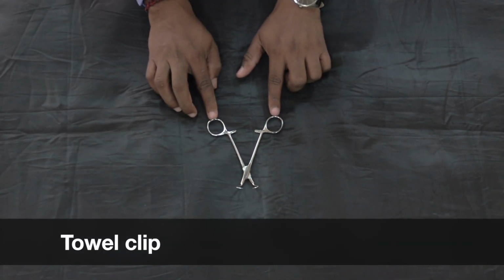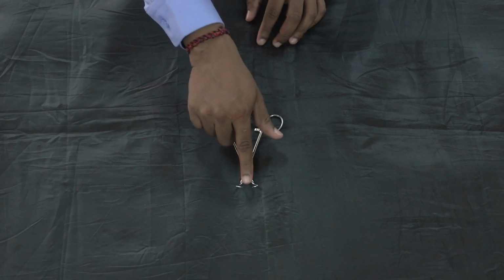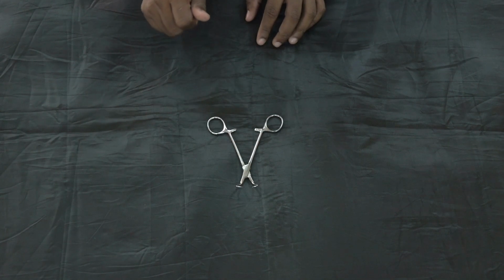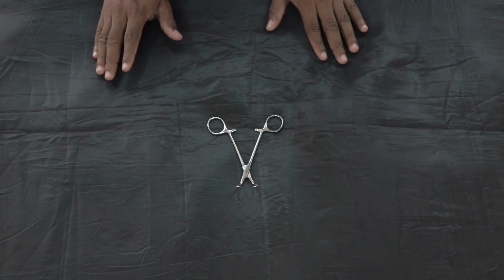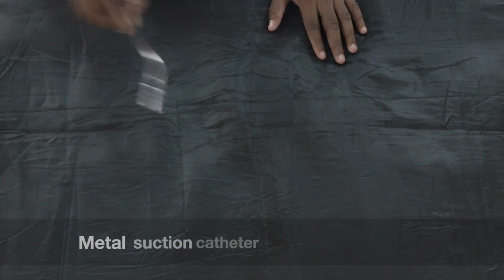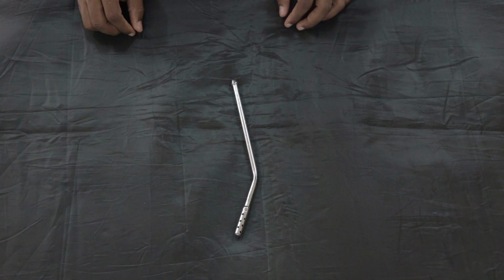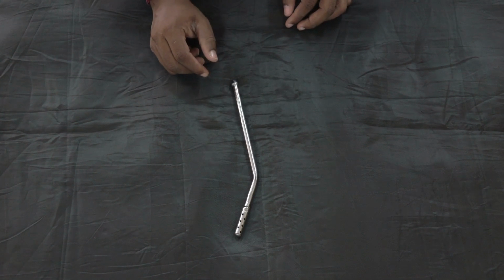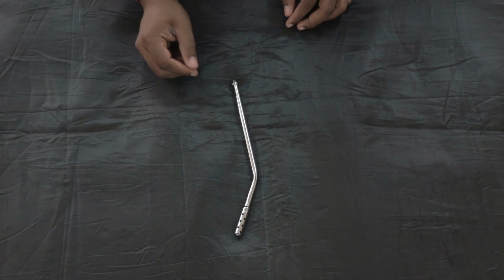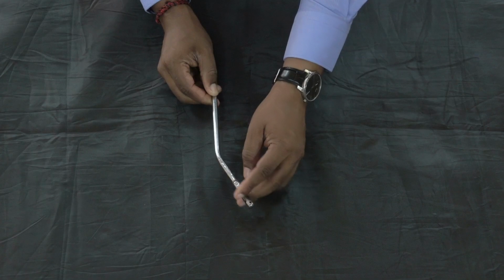This is a towel clip, which has a tooth tip to hold the towels after draping the surgical field. This is a metal suction catheter, which is used to suck the secretions and the blood in the surgical field, and the end has some fenestration to suck the secretions.